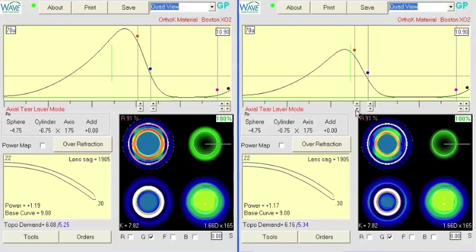And looks like that's about the closest. So we can see with the original lens, where we have this larger OZ, we're crossing 20 microns with the tear film at about 2.96 millimeters. With this new lens, we've shortened the OZ by a full millimeter, and we're crossing 20 microns at about 2.94 millimeters.